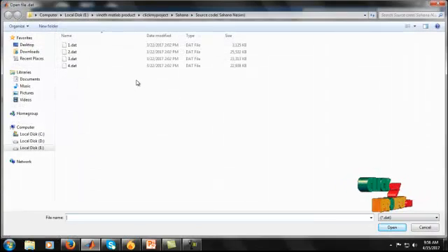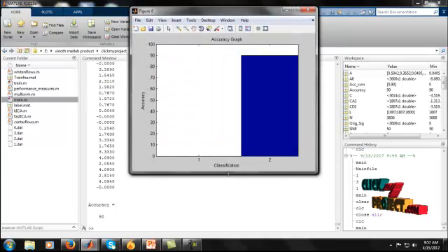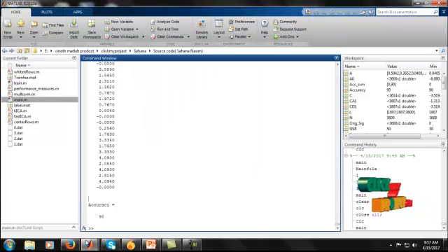After running our program, the code will go to the dataset. There are four different datasets. It is our DAT file. So we have to choose any one of the datasets. So it is our process.